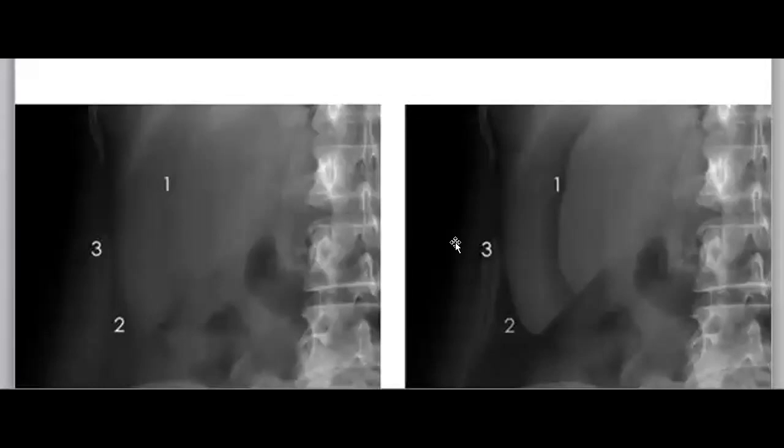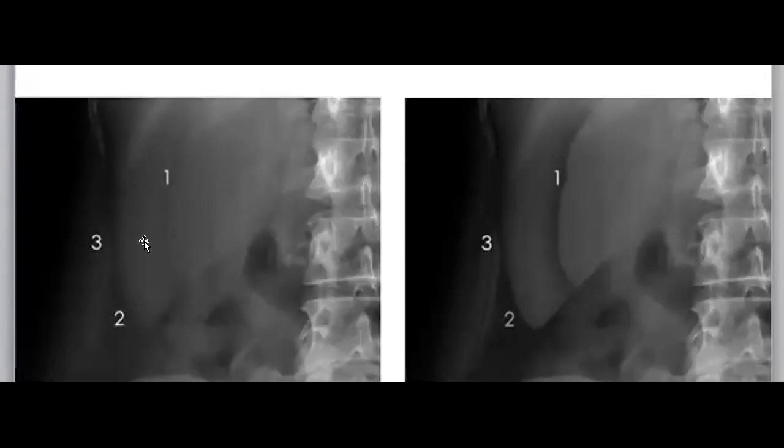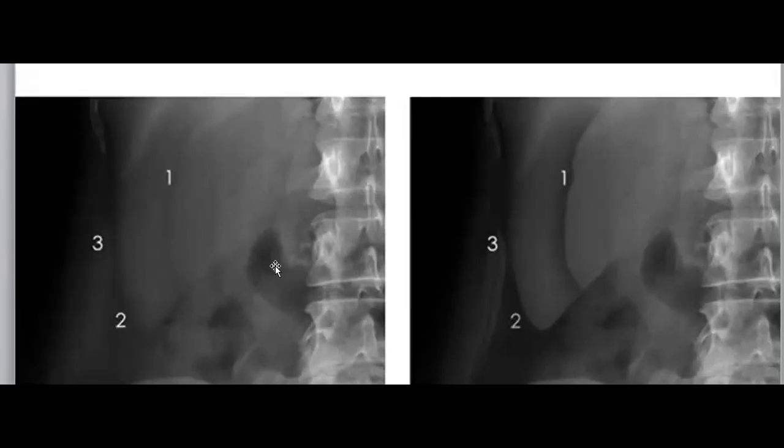And here also it can sometimes be tricky to think that it could be pneumoperitoneum, but it's not, because this one is the perirenal fat, which is retroperitoneum, this one is the peritoneal fat itself, and this one is the abdominal wall fat. So these are three layers. A good clue is to compare it with the true air, for example air in any bowel lumen. So you can compare both and see if it is free air or not.